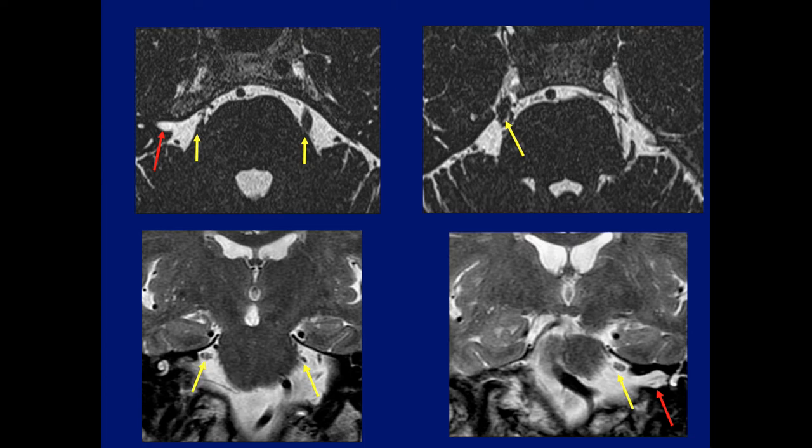Now, this is just to show the problems why we don't see the trigeminal nerve completely. See, look how off the image is here. Here we see the IAC on one side, not on either side, on the opposite side. And that's why we see the entire trigeminal on the left, but only part of it on the right.